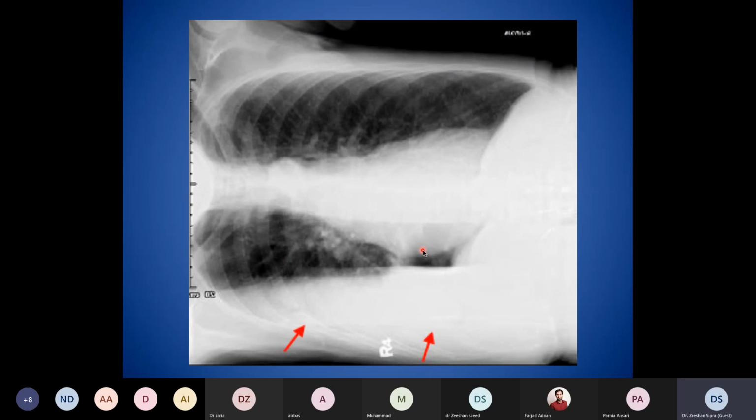Lateral decubitus, I hope so. We usually don't need that, but to complete the projections acquired in radiography of the chest. This lateral radiograph is usually acquired in a patient who cannot lie erect, for example with pneumothorax, and also to document if there is pleural effusion, for example like this, with an air fluid level. It's especially important in a few cases of foreign body inhalation and in pneumothorax specifically.